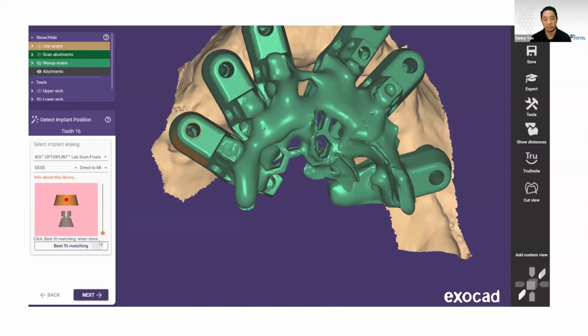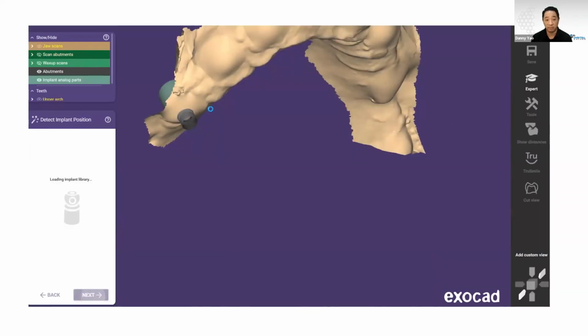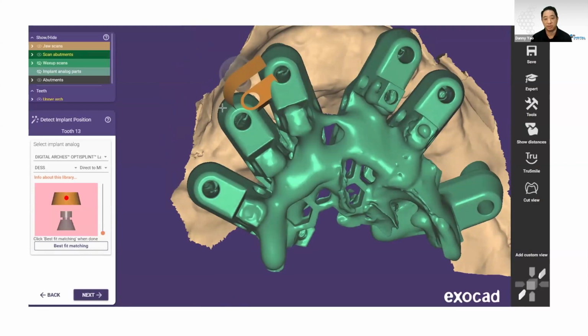And I want you guys to notice how our scan bodies are a little off. When you're trying to align them, it's going off to the right, and then even aligned to the wrong scan body in this situation. And we're having a little trouble here.